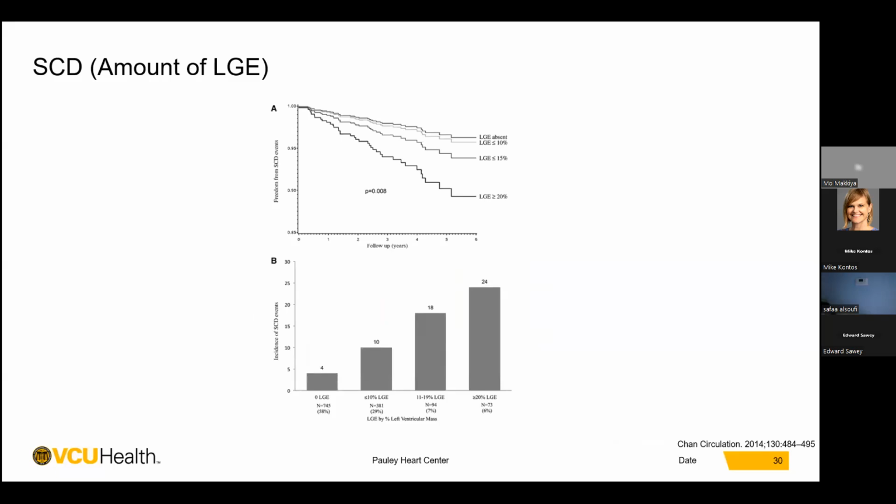With cardiac MRI, we can evaluate for late gadolinium enhancement, which indicates areas of fibrosis in hypertrophic cardiomyopathy patients. We can also quantify or measure the amount of LGE and the percentage of the LGE of the total myocardial mass. Bear in mind that about 50% of hypertrophic cardiomyopathy patients may have negative LGE.